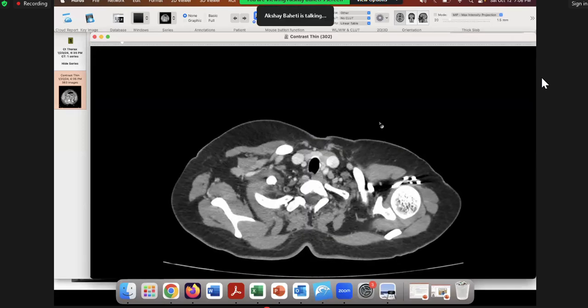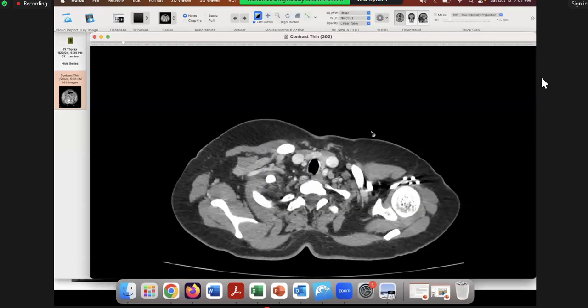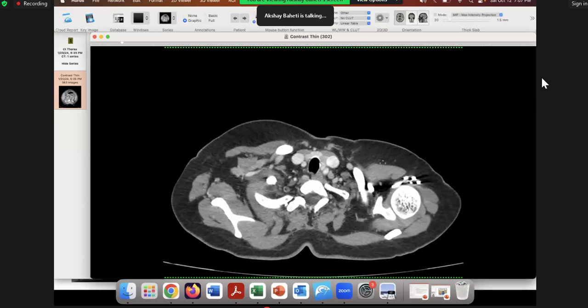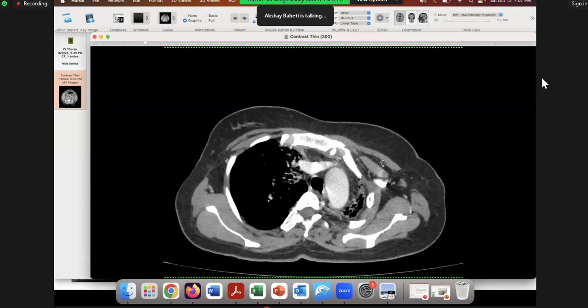So when you scroll from top to bottom in an abdominal case, at this section, which node are you searching for? Most abdominal cancers go to which node? Left supraclavicular. Yeah. So you see a small node here. I wouldn't say it's huge, but there is a node here. Okay. So you would mention it in the report. It's not super big. It's around 9 by 6 or something. But you mention it because we know that ovarian cancer spreads to nodes, and because of findings that you'll see later on. Yeah, now I'm going further.